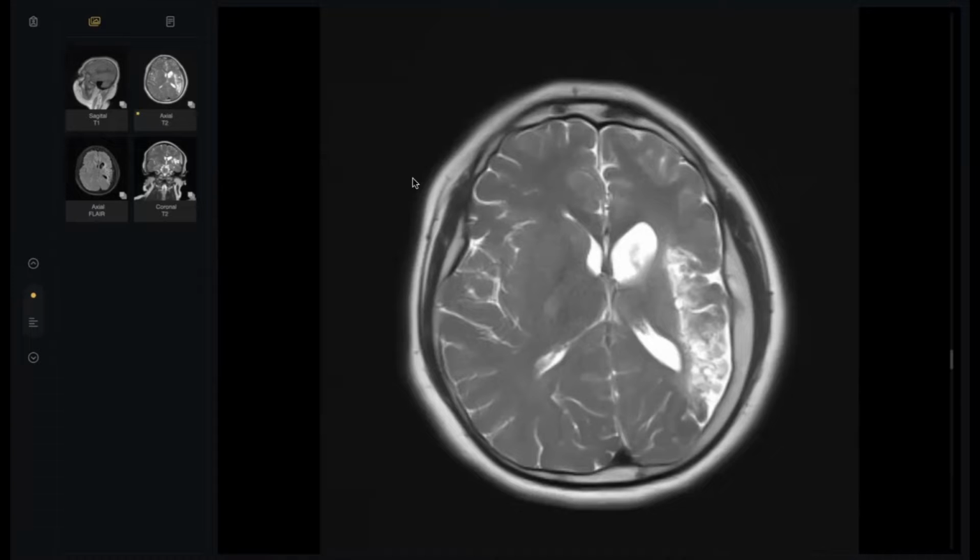and the presence of hemicerebral atrophy and thickening of the calvarium, my provisional diagnosis is Dyke-Davidoff-Masson syndrome, which consists of ipsilateral cerebral hemiatrophy and thickening of the calvarium. Other less likely differential diagnoses include Sturge-Weber syndrome on the left side or left side Rasmussen encephalitis.